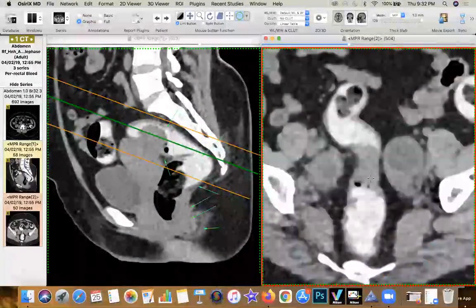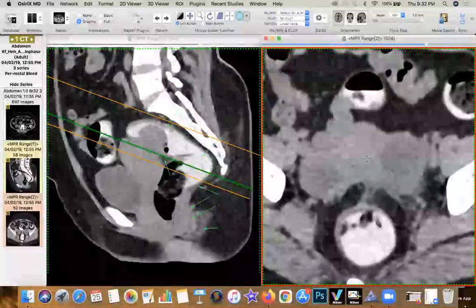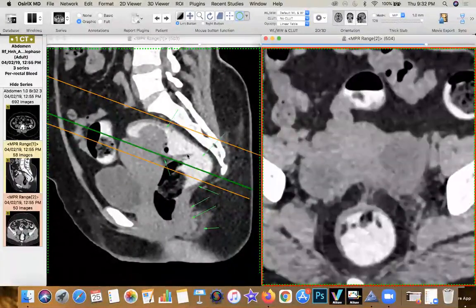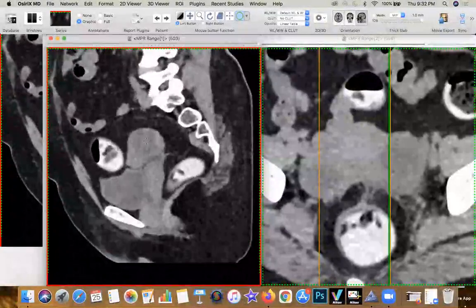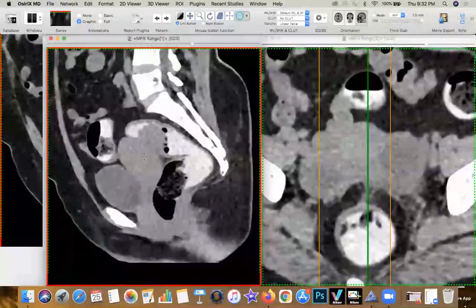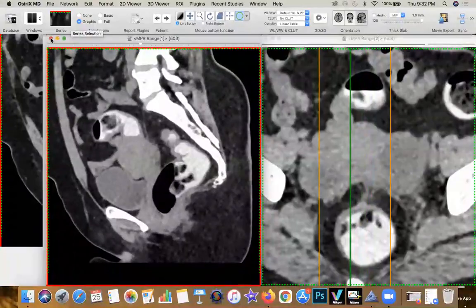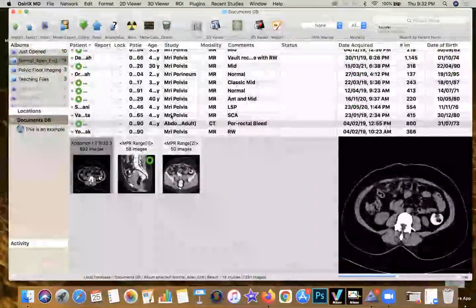So now you've got to start thinking what's happening. And also what you notice is both ovaries, though they're so bulky and large, they're kind of plastered laterally to the uterine surface. So you can see that the ovaries both are kind of plastered to the uterus per se. So now let's go and see, when we did the MR, what was the appearance of this pathology.